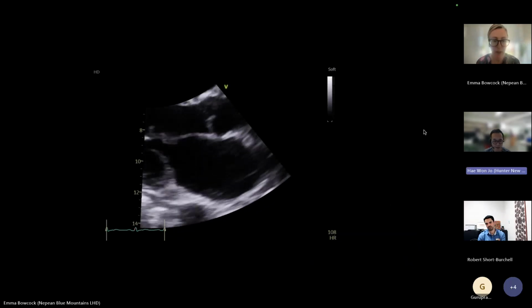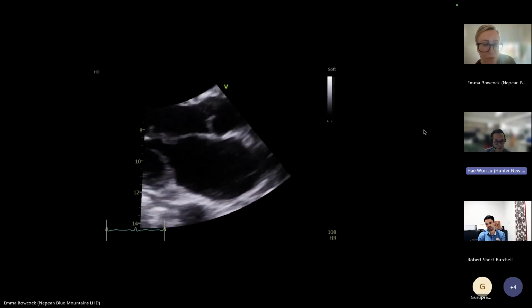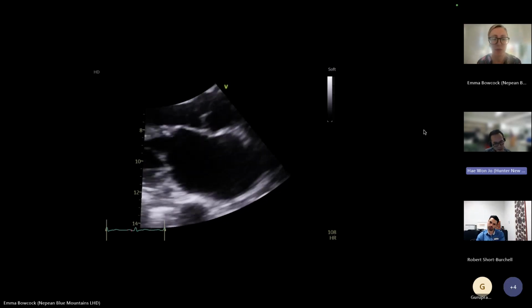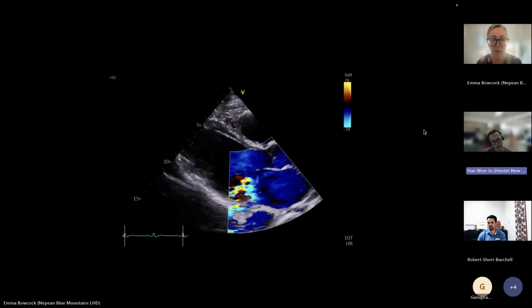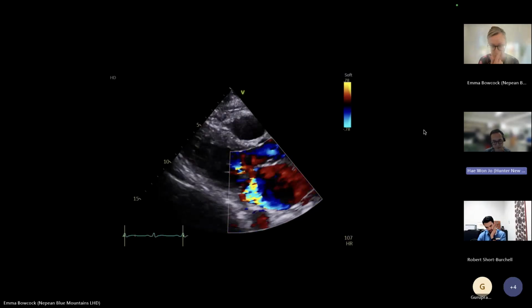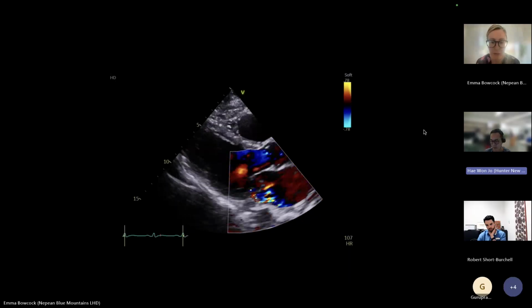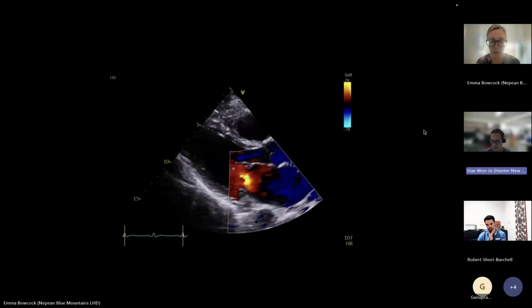Again, a focused view of the mitral valve confirms what we saw earlier. Echogenic mass with independent motion in the upstream portion of the valve. I can see it mainly involving the anterior leaflet on this image. There is significant eccentric posteriorly directed MR, consistent with vegetation in the anterior leaflet, especially if it's causing things like flail leaflet.